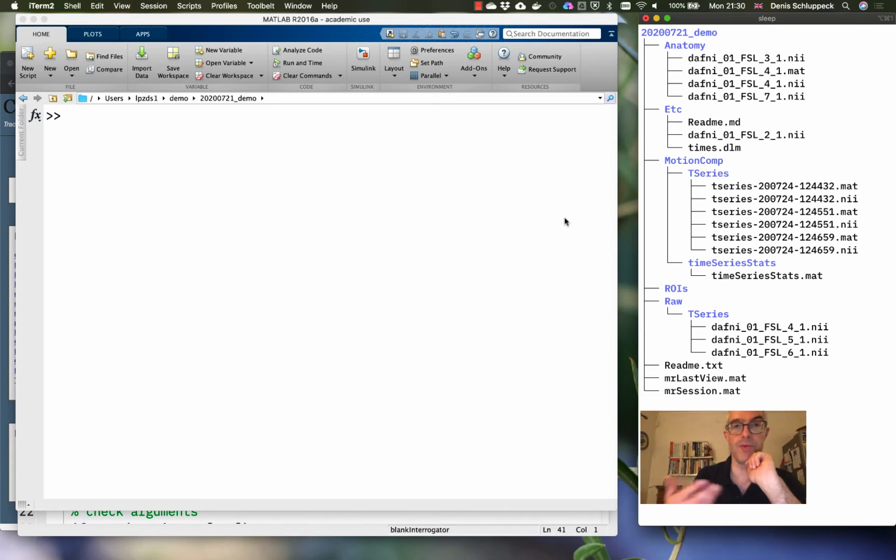You can do arbitrary model fitting and various explorations and make nice plots, which allows you to look around some data sets, especially if it's something slightly more unusual, like often was the case with 7T data sets, or when you have very high spatial resolution, or when you're trying out something slightly unusual.